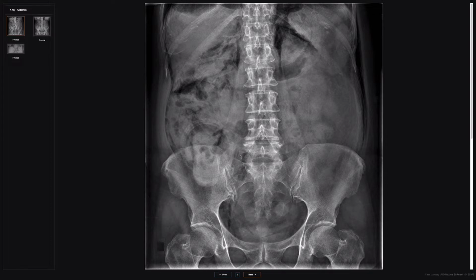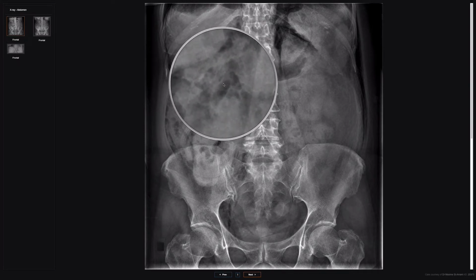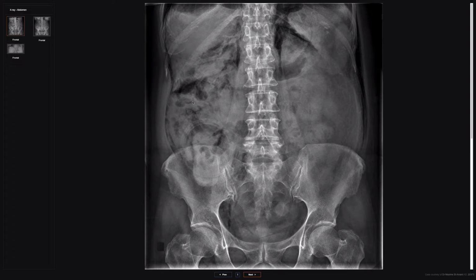So when you have air within those areas, rather than showing up as a balloon of air, what you'll see is this kind of wispy pattern where air is dissecting between the tissue planes. And so as those different layers are lifted up, then rather than seeing a big blob of air, you'll see wispy, linear, curvilinear, soft tissue lines and bubbles of gas around it.